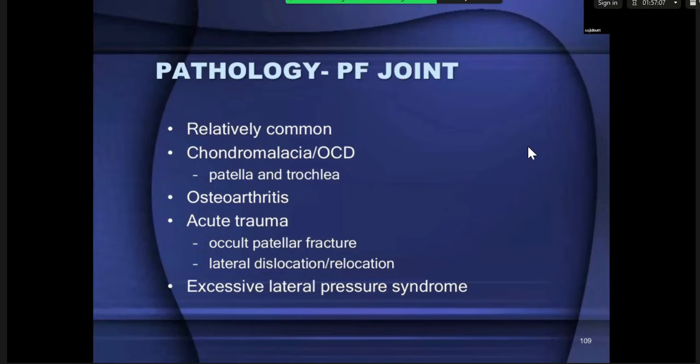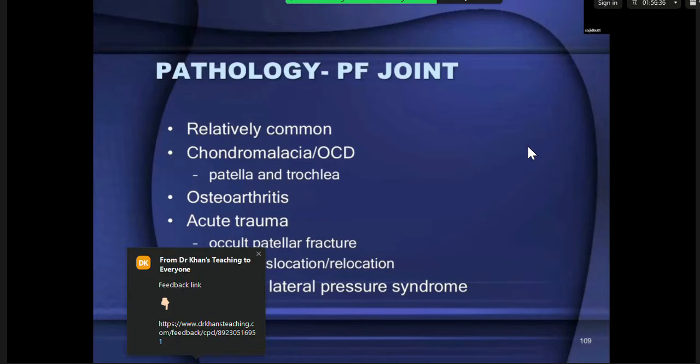Patellofemoral joint chondropathy is relatively common and traditionally and historically is underreported on MR. That's actually one of the usual complaints of the knee surgeons from us. Because once they put an arthroscope in, the first thing they see is the cartilage of the patella. They identify that the cartilage is soft, you can easily probe it, it's looking blue and horrible. And when they see the MR report, we've said that we can't see anything wrong with the cartilage because we can see it smooth. MR tends to undercall it.